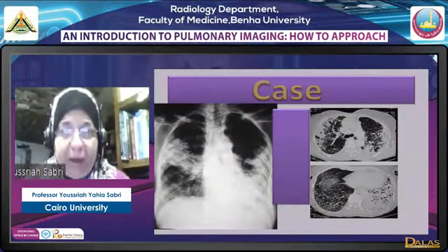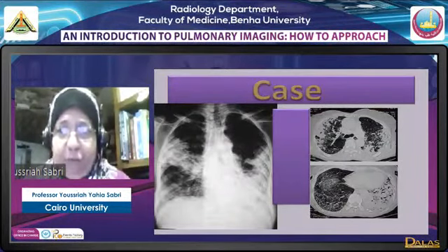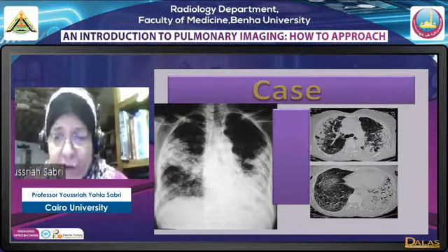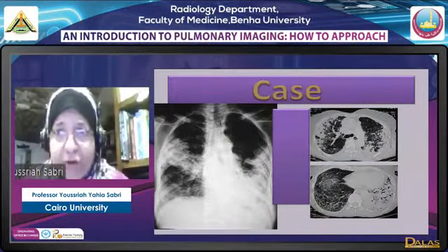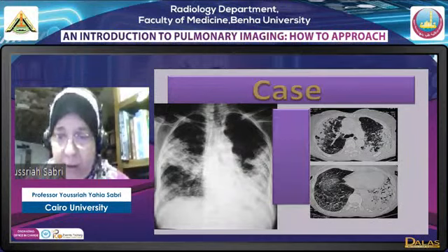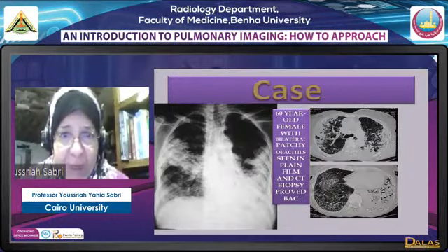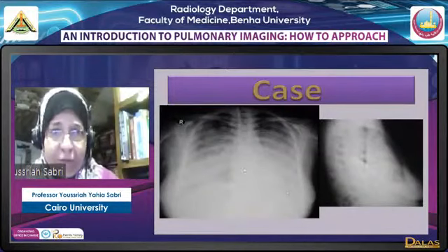Now, here another case. This was an elderly patient that was diagnosed for months as bronchopneumonia, and then finally they decided to take a biopsy, which proved, at that time diagnosed as bronchoalveolar carcinoma. Of course, you all know that this terminology is no more in use, and this is one pattern of adenocarcinoma in the lung. Okay, and this patient is a 60-year-old female with patchy opacity seen, as you can see, and this is a very common history, by the way, this follow-up of pneumonia for months.